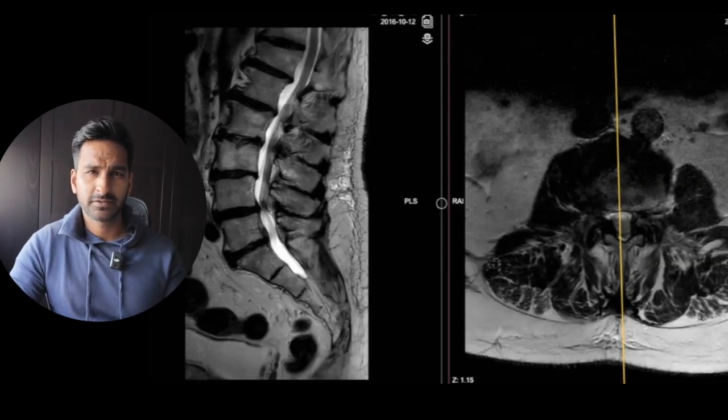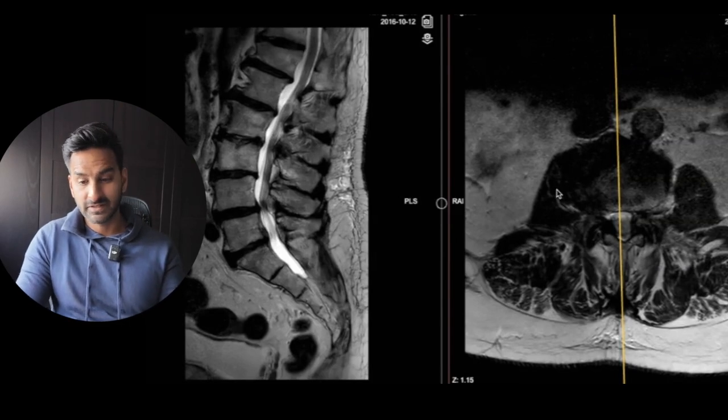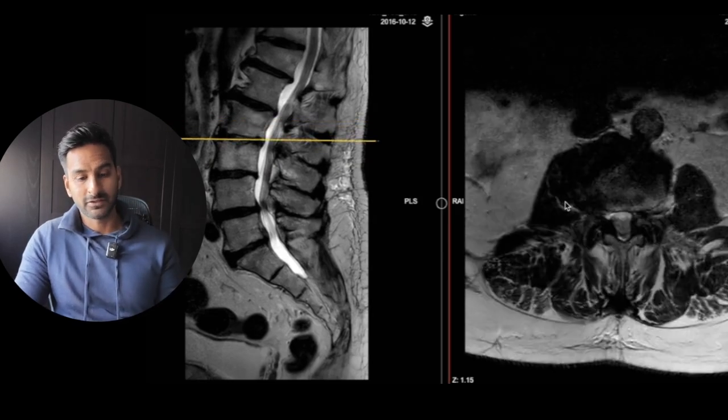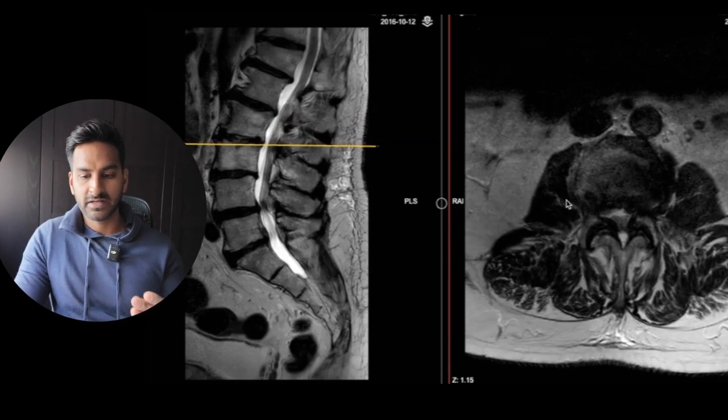My name is Dr. Lask, I'm a consultant radiologist, and what we're going to be doing is going through a quick video on degenerative spines. Now, when you look at degenerative spines, they can get a little bit daunting, and the current case that I've got up right now does look like there's a lot going on. But what we need to do is look at it on a level basis, and just have a look at every single level and try and figure out what's going on at each level before you move on to the next level.